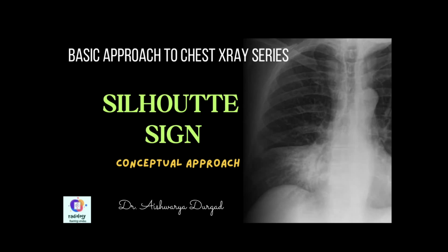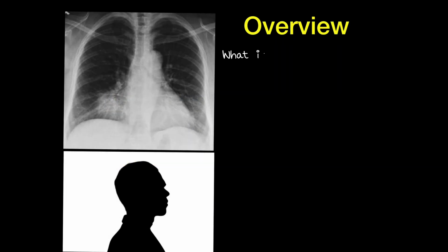This is basic approach to chest x-ray series, and in this video we'll learn the concept of silhouette sign, one of the chest x-ray signs very important for exams and also in day-to-day clinical practice. So first we'll see what all we'll learn in this video. What is silhouette sign?